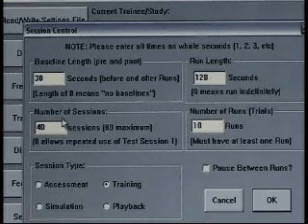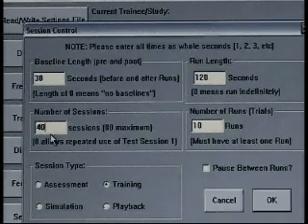The number of sessions, you can go to a maximum of 80, or you can put a smaller number in. Oftentimes in a remote scenario, or if you're using Session Librarian, you may only want 5 or 8 so that it forces the client to keep communication back and forth and they don't just fade away. In the clinic, you may say 40 is the max number I want to run because we definitely want to make sure that they're getting benefit prior to that.